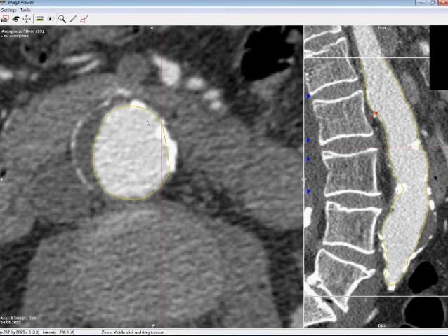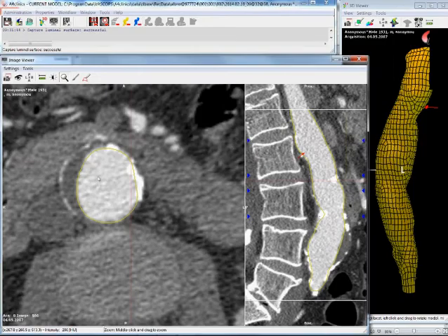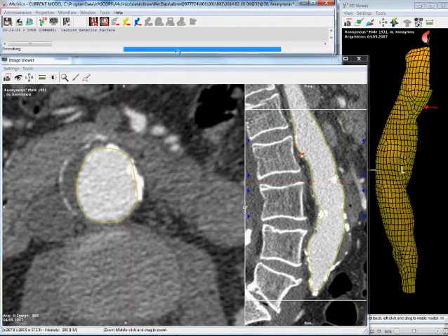Now comes the more tricky part, to segment the outer surface of our aneurysm here, and you see that we have a lot of tissue around with the same gray value, and that of course makes it much more difficult. What the software is doing is, I just click the next button, which then introduces a blue balloon. This blue balloon inflates and tries to capture the exterior surface.